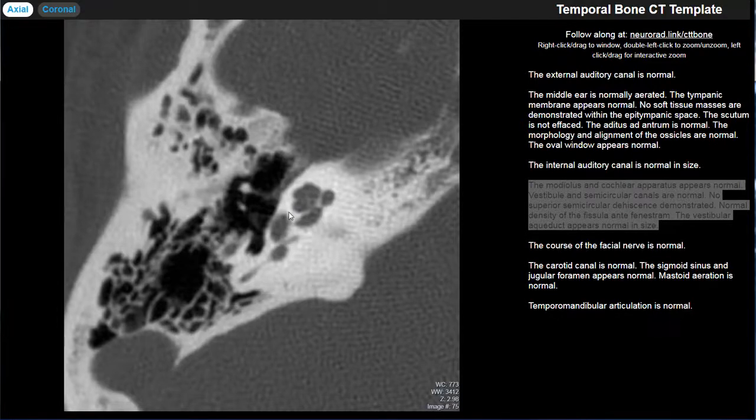When you get otospongiosis or otosclerosis, it starts with bony resorption of enchondral bone, and it tends to start in this area. So become familiar with what normal bone looks like in this area. In front of the oval window, lateral to the cochlea, should be nice and dense. If you're losing density there, that makes you concerned about otospongiosis.